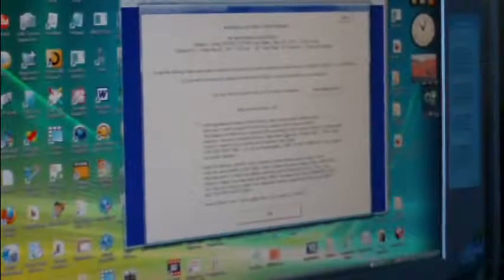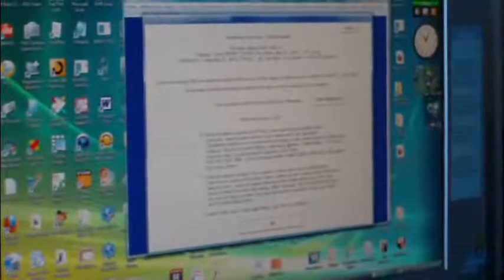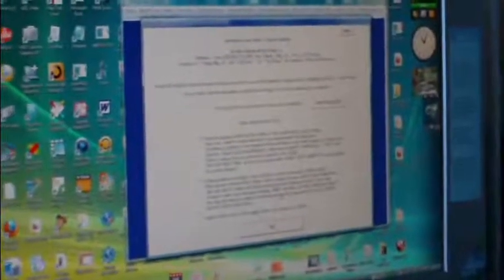In an opposite situation, your physician, your diabetes caregiver, may have set up the Internet Data Storage location for you, not yourself, in which case they simply told you the location of it. And after they tell you the location of it, that data set at that Internet Data Storage location is the one that is empty. And you may have been doing some work on your computer before you were so informed by your diabetes caregiver. In that case, the one that is in your computer is the one that contains data, and the one that is at the Internet Data Storage location is empty. So in that case, you would choose the one in this computer.